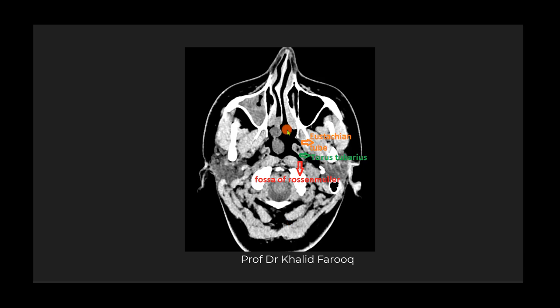Let's discuss some benign findings in PNS areas. Here we have an axial CT image through the PNS area. This is the area of the nasopharynx.